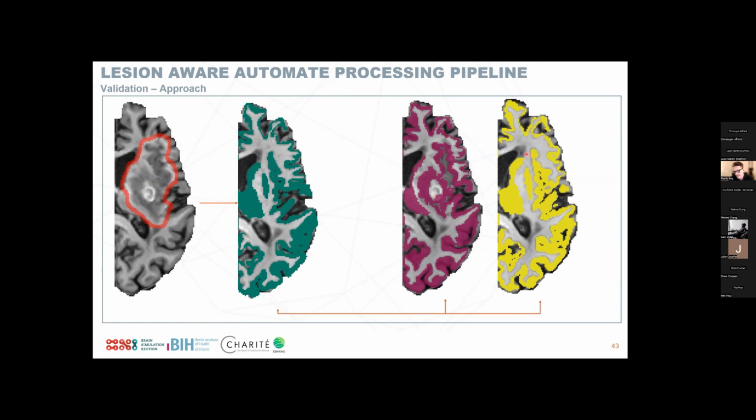And then we see, after we did the lesion correction, the extracted cortical ribbon here based on LEAP, and we see this is significantly, just visually now, comparing those to the ground truth, that this reconstructing ground truth seems to be working fairly well for LEAP, but it's not working very well for the HCP, because of course we have this distortion of the lesion itself.